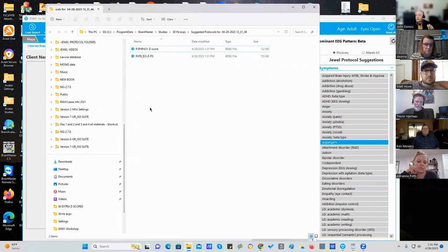So that choice is important because there are lots of times we have maps in which the power is like, what is this? Now, typically amplitude training is great because we can reward a specific frequency. But if you're saying, no, I want to stick with Z-scores, and that's fine, then we just switch to coherence.